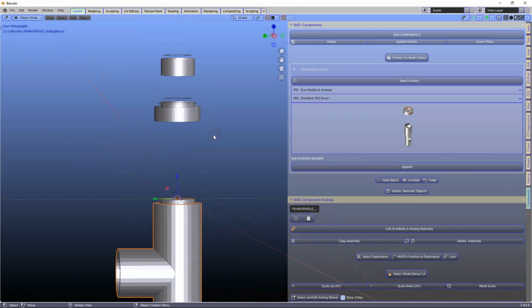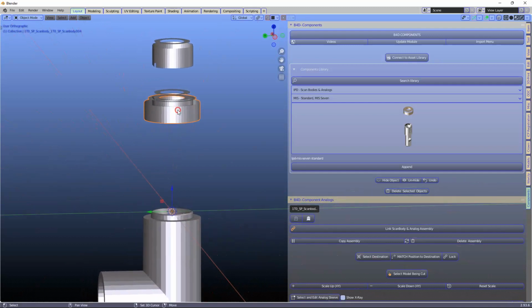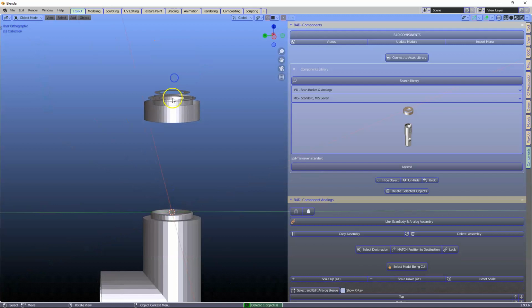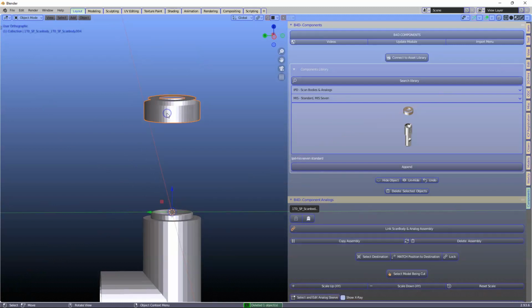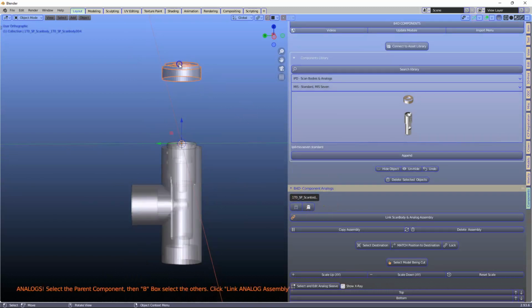With the IPD we have different scan bodies, so this depends on which one you're using. Now the part number is on the left hand side, so you will have to choose the scan body that you're using and then you will delete the ones that you're not using. So let us join these together. In transparent mode we will then link them all up.